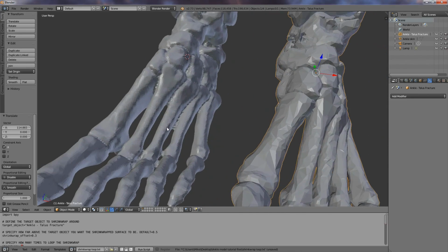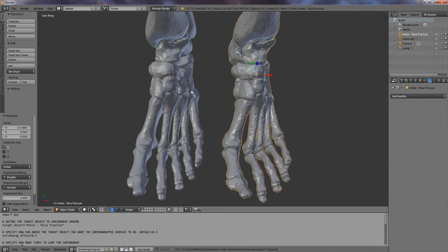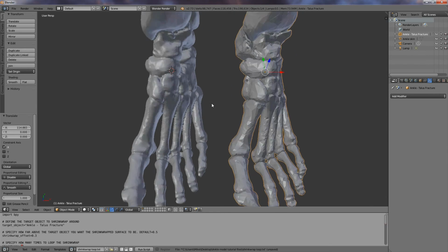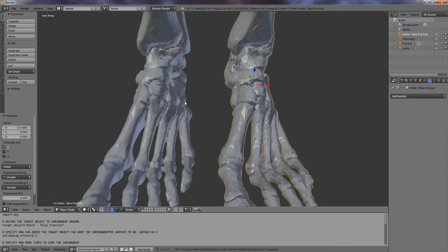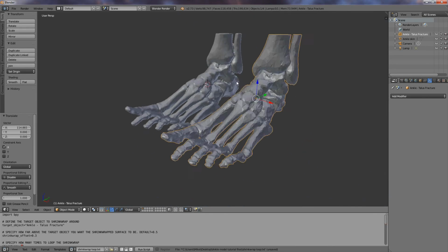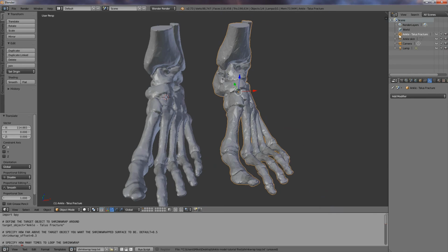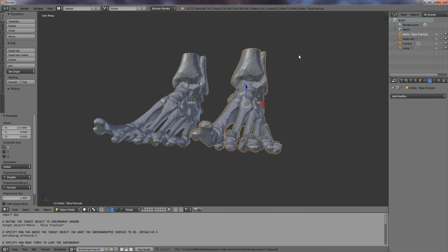And our remeshed version is much smoother. So in my opinion, this technique of using shrink wrap and remesh generates output files that are actually superior to the original file that you started with. So not only have you corrected the mesh errors, but you've actually made a surface that's much more realistic. So that's about it for this tutorial. I hope you found it helpful.